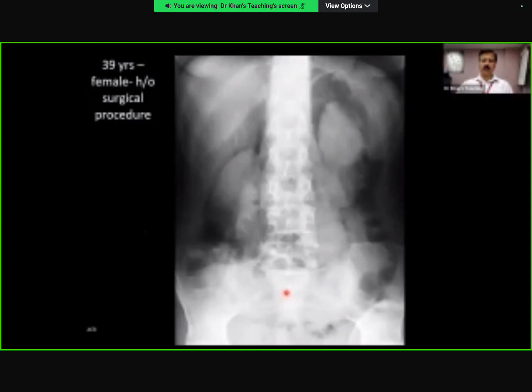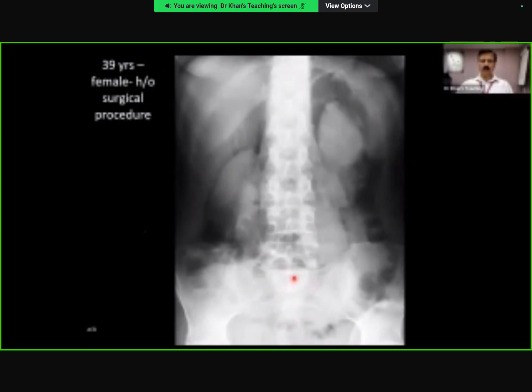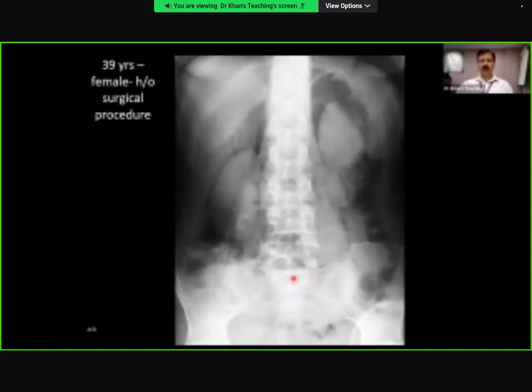So the learning points are, where do you see retroperitoneal gas? Outlining the psoas, outlining the kidneys. Excellent. And it should be in the deep pelvis, outlining the rectum, which is a part of the retroperitoneum. That outline will be very difficult to see. The lesser sac you can see, but obviously on plain film it's difficult to pick up. Is the lesser sac by definition retroperitoneum? You remember the lesser sac has a connection with the peritoneal cavity, so that's peritoneal.